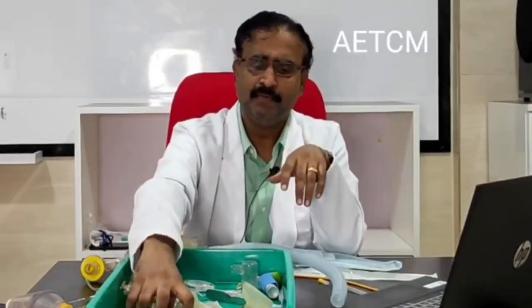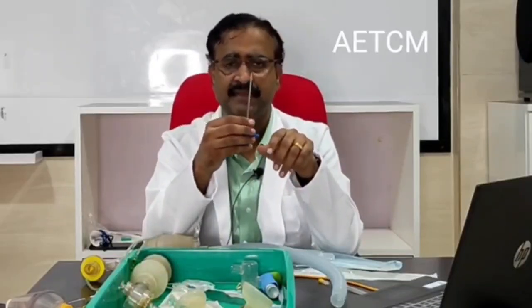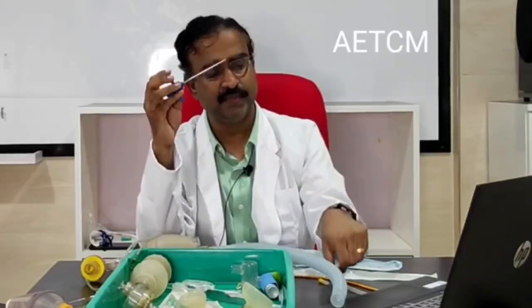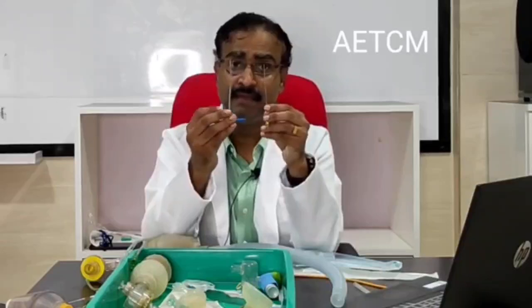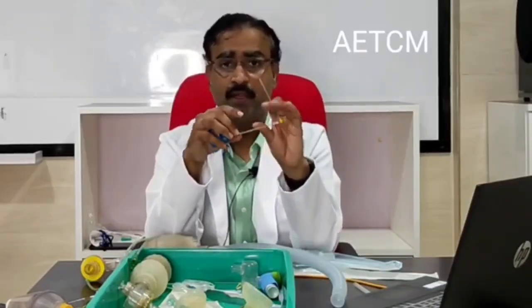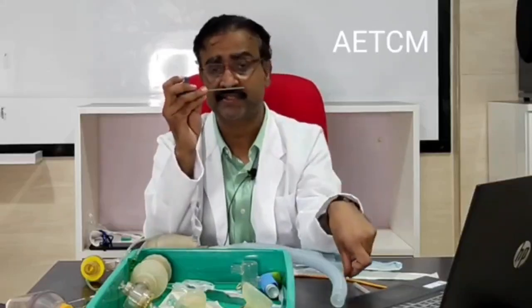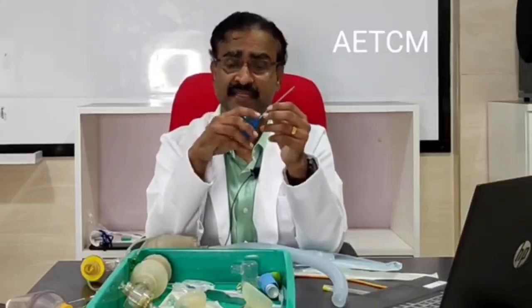The next instrument we would like to discuss is a bone marrow needle. A bone marrow needle is a very tough needle. At times, looking at the length of this particular needle, there is a chance you may mistakenly say that this is an LP needle. But look at the LP needle, it is ready to bend, but not a bone marrow needle. It is extraordinarily strong. So there is very little reason to get confused with other needles.